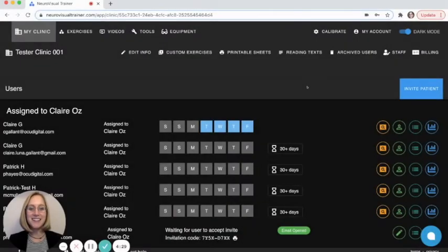Welcome, my name's Claire. I'm with NVT, and today we're going to show you a little bit about billing, a good bunch about pricing, and we're also going to show you about archiving and setting expiry dates on patients. Since it's all interlinked, it's all related, and I'll show you exactly how here.